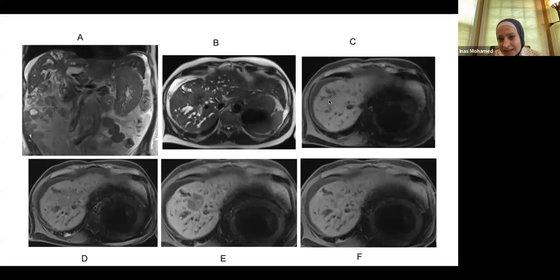So this is arterial, this is portovenous, and this is delayed.